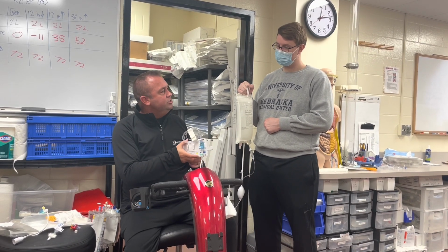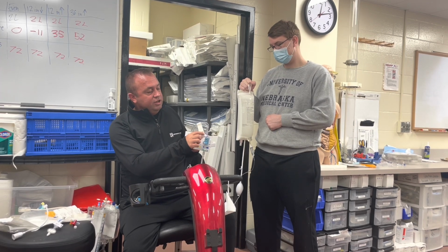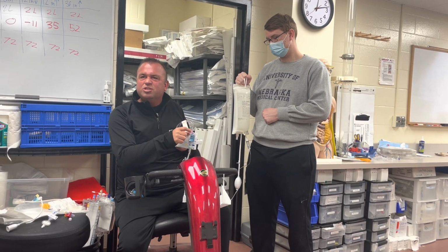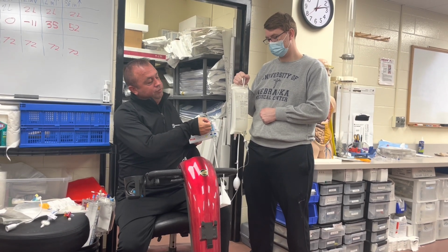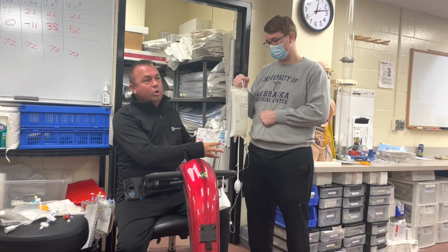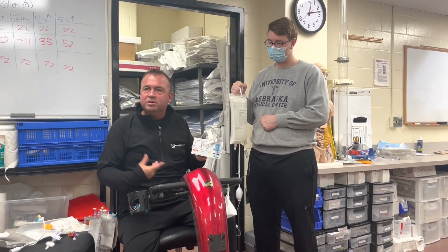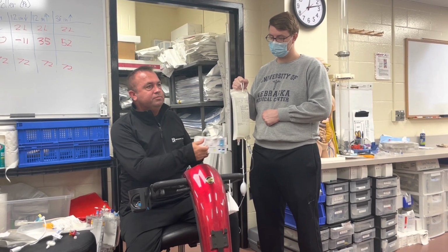A lot of times what I like to do, just a quick thing, I'll pop my syringe out, and there's always a little bit of blood left in this little part right there, right? And every single time you take that on and off, it gets your syringe and your gloves messy. I'll either pull off my glove and run a little fluid out into my glove, or I'll use the syringe wrapper that the syringe came in and flush that into the wrapper so it doesn't run onto the floor, and then throw that away. That's just a little trick of the trade.